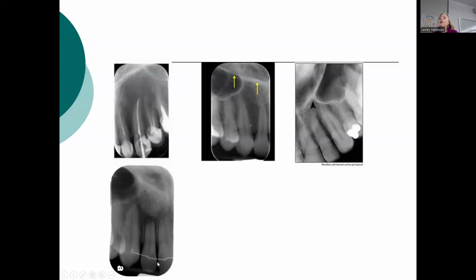Again, here we have our canine, our anterior teeth, posterior teeth, canine, posterior, anterior. This one is that one again with a lot of foreshortening. It's taken at a strange angle. And look how flat the canine is. There's no pointy canine, so it almost looks like a lateral, really. But you have to label your teeth, find your canine, label your lateral and your central, find your premolars, and then you can figure out your anatomy: maxillary sinus, fossa, inverted Y. So it takes repetition.